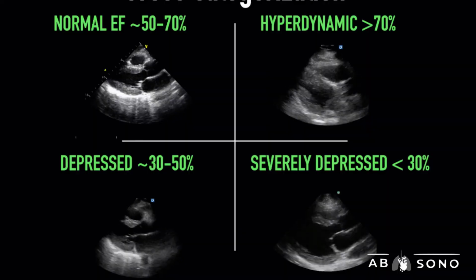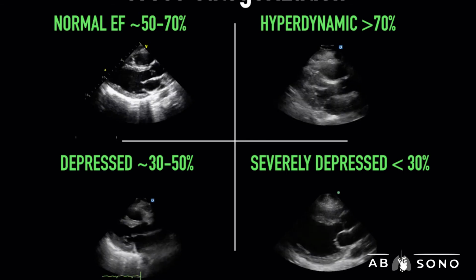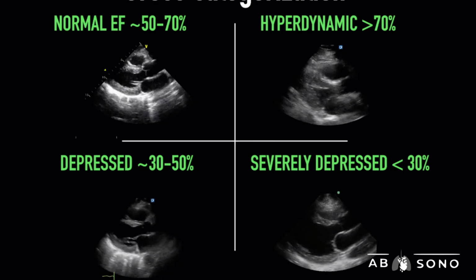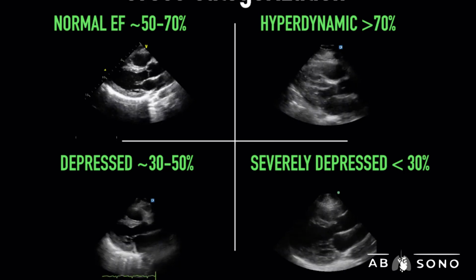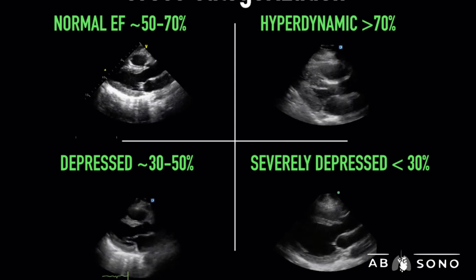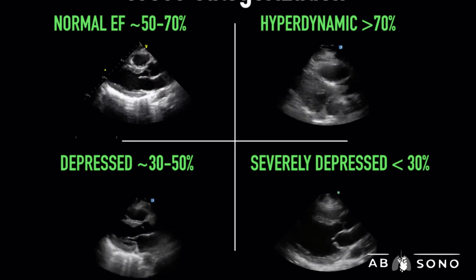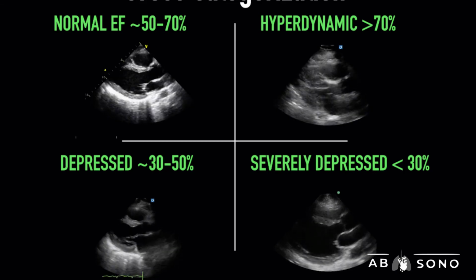Grossly, you can categorize LVEF based on these big categories. The above clips give you some examples of different gross LVEFs. Once you have seen a couple, gross assessment becomes rapidly easy. I would venture that most people can rapidly call numerical LVEF. Where it becomes tricky is very precise assessment, particularly along the 30 to 40% range, where there are cardiology management considerations such as ICDs. For most of us, though, this degree of differentiation is not essential.